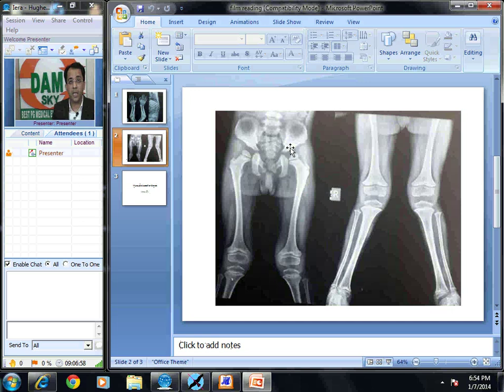Now look at the iliac wings. Iliac wings are flared, they are very wide, flared. While as I go towards the acetabulum, the iliac blades are showing a narrowing or constriction. So they are broader here and narrow here. This has been called wine glass shaped iliac blades.